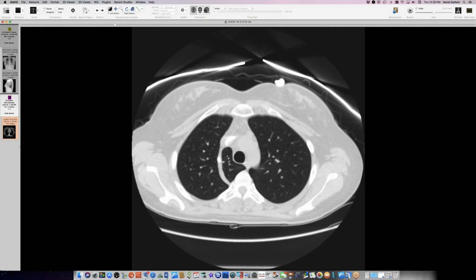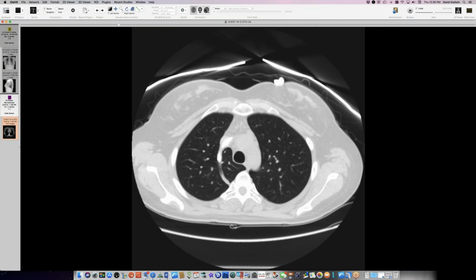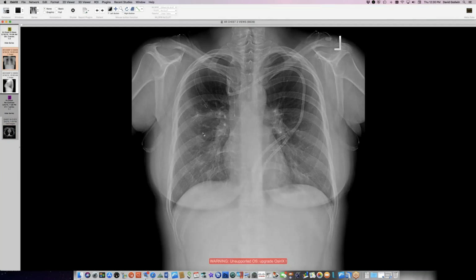So, you think this would be a rare event, but maybe with azygous lobe, the origin of the azygous vein is a little bit higher and maybe more of a straight shot for the left brachiocephalic catheter entering it. It seems to cross the mediastinum and just be headed right for this thing. So maybe this actually predisposes to getting a catheter into an azygous vein by the lateral and upward displacement of the azygous vein. So kind of cool.